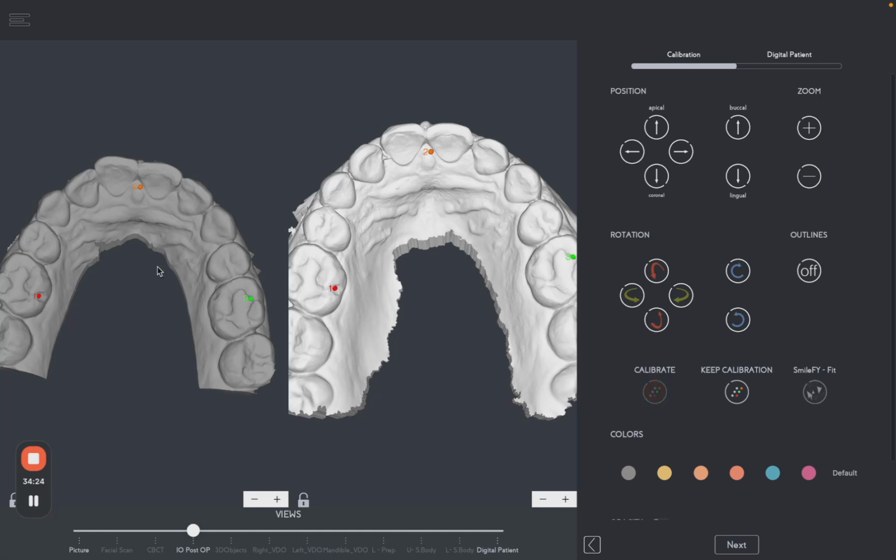Since or if you have the majority of the teeth prepped, you want to use the gum palatinal area as a reference. In this case, the premolars and molars were not prepped on the occlusal view, and therefore I used the number 1 here for the first molar.